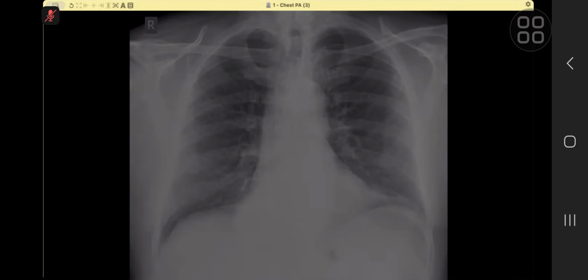Okay. Apart from that, actually, a chest X-ray lateral was done. Looking at the lateral radiograph, there is an opacity noted at the lower lobe region. Lower? It is a biconvex shape. Sorry, say again. There is an opacity noted in the lower lobe. It is of biconvex shape.